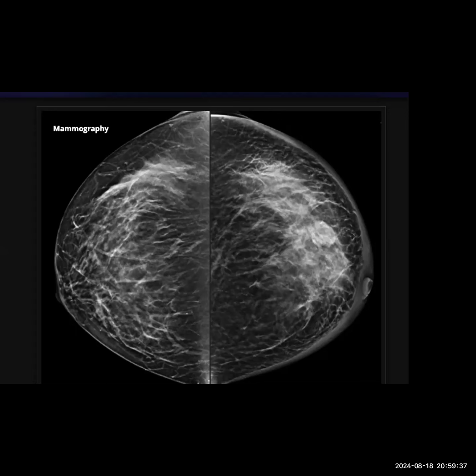You already said this patient had a PET uptake; with the background of this lesion, would you still give it only M4? Okay, with the background of lymphadenopathic uptake, I will be giving it as an M5 lesion. This patient needs immediate referral to the one-stop breast clinic. What is the one-stop breast clinic? It is the referral center in the NHS where clinical, histopathological, and radiological examination are done in the same sitting for the immediate diagnosis of the lesion in a female patient.